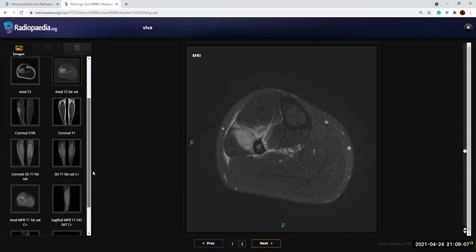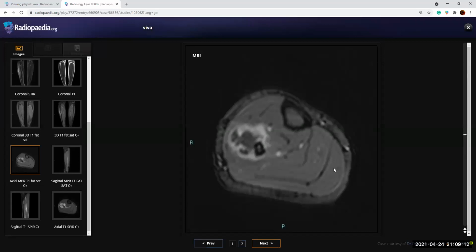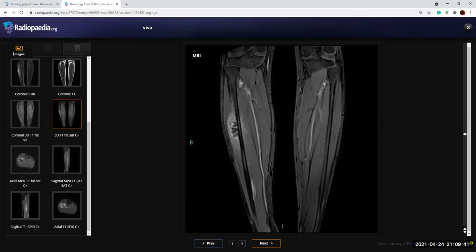You can take. Okay, so here I can see a peripherally enhancing irregular lobulated collection in the edematous changes I had seen. So this region most likely represents an abscess with reactive periosteal reaction in the fibula. I would like to convey these findings to the on-call. Just have a look at the coronal images.